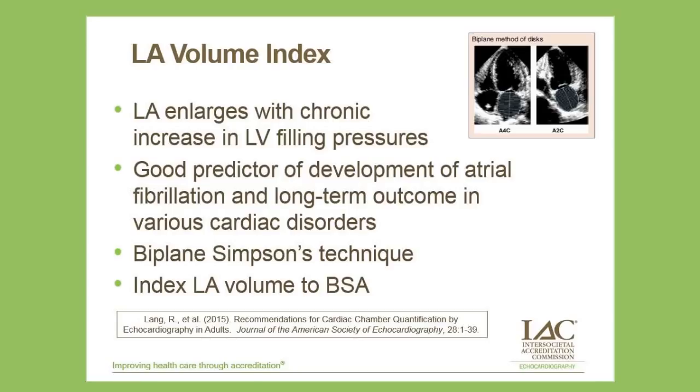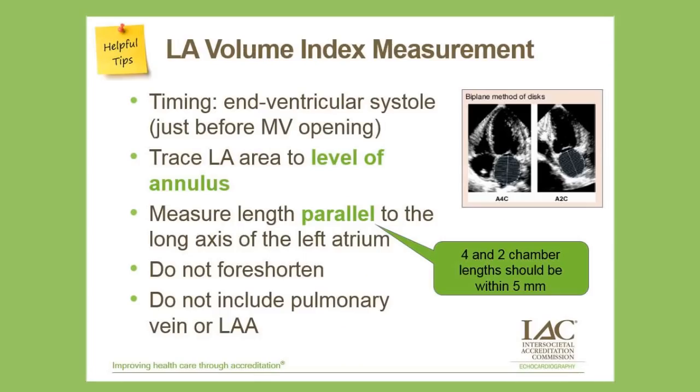Now, I know some people are still measuring the LA dimension. The challenge with that is it's one-dimensional, essentially, and so you're not really getting a good view of the overall LA size. So we really recommend doing an LA volume index in two planes. The timing of this measurement should be in end ventricular systole, so it's just before mitral valve opening.